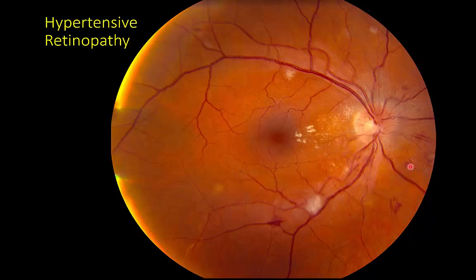We can see our dot and blot hemorrhages here. We can see a flame-shaped hemorrhage here. We can see a cotton wool spot here, more cotton wool spots. So this is the typical finding we might see in hypertensive retinopathy. And again, the findings in hypertensive retinopathy and diabetic retinopathy are very similar. Not a surprise when you think about lacunar strokes in the brain caused by hypertension and diabetes. The pathology is very similar.